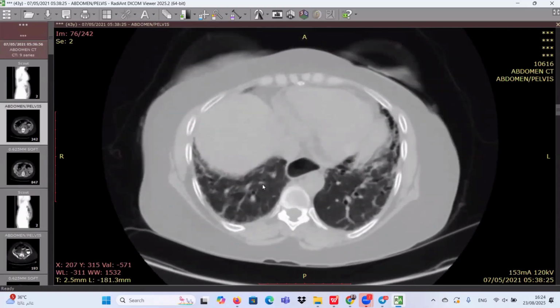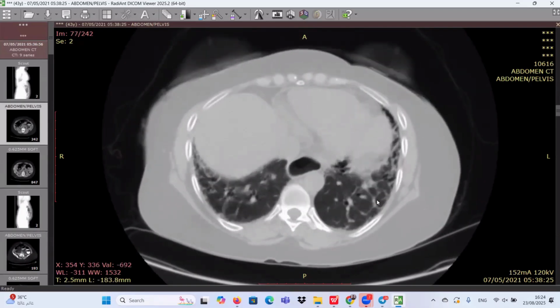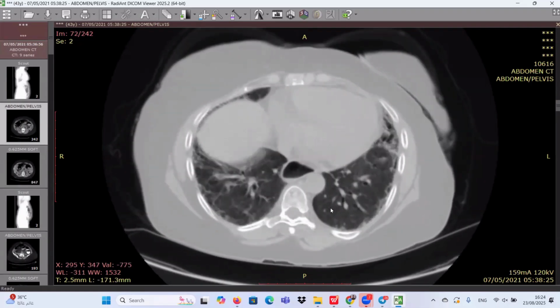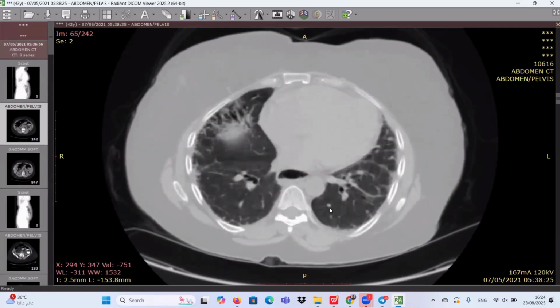The middle lung loop. And more pronounced as the basal lung segments, forming cystic honeycomb changes. Once we have something like this, we will think of interstitial lung diseases, usual interstitial pneumonitis. Once we start the chest cases, once you have something like this, we have a few points you should check. One of these points is esophageal dilatation, and as you said, we have esophageal dilatation with interstitial lung disease.